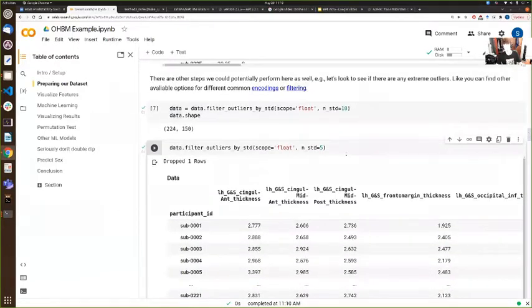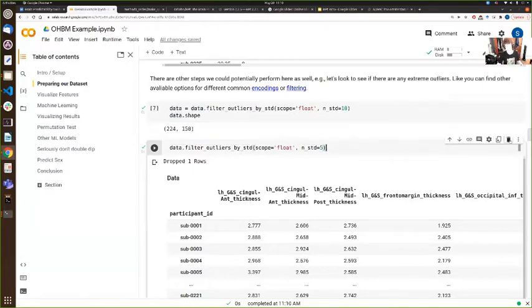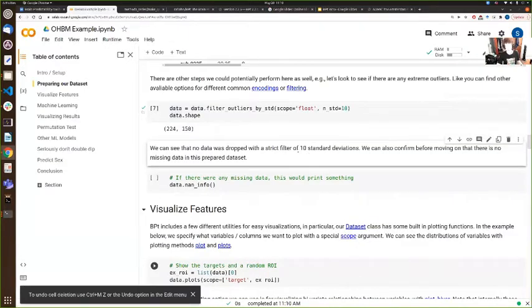But essentially this is just a technique for finding those really extreme outliers, where the pre-processing went crazy and made 6 ROIs, and there should be 150, as in the case of this Destrieux atlas. So we'll skip this for now.